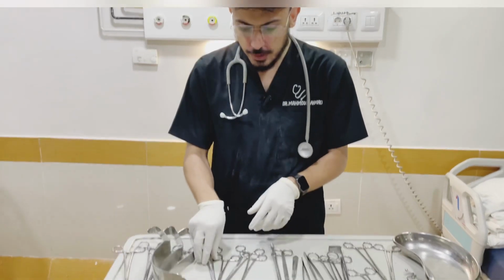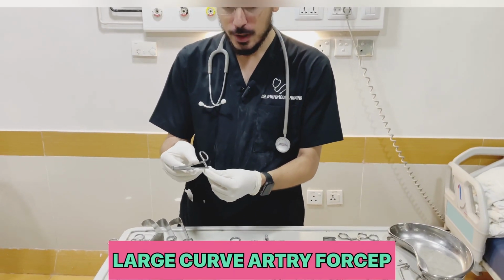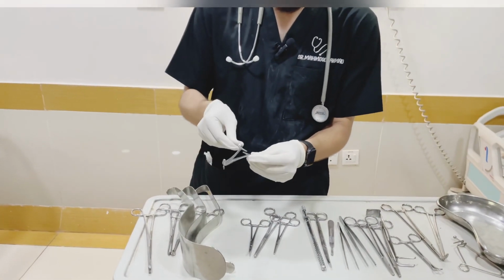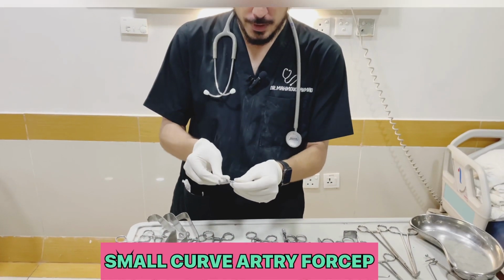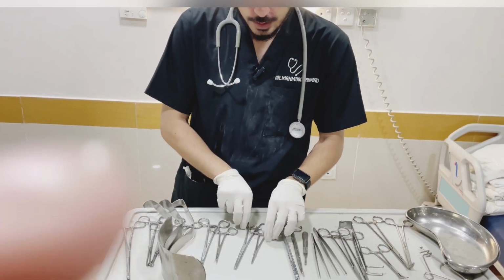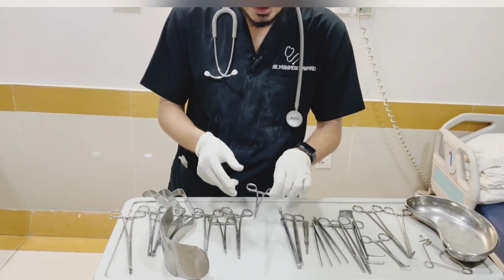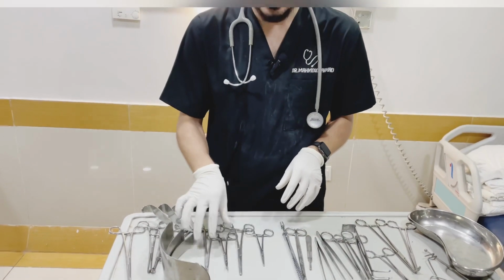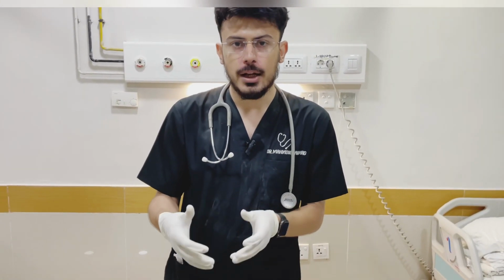Now these are the different artery forceps. This is the large curved artery forceps. You can see at the end it is a bit curved. This is the small curved artery forceps, this is the straight large artery forceps, and this is the small straight artery forceps. These are the artery forceps, and usually they are used to control bleeding from blood vessels by clamping the artery.